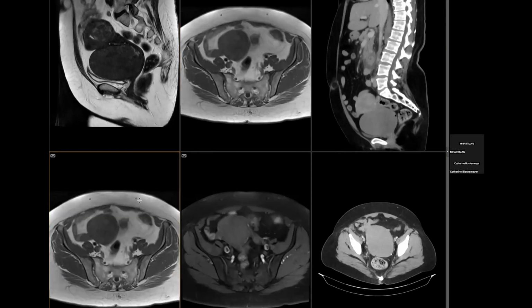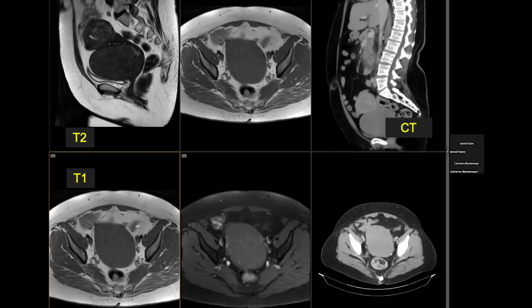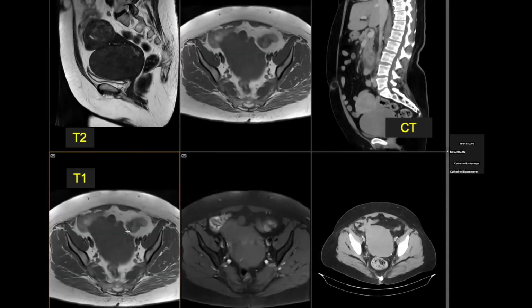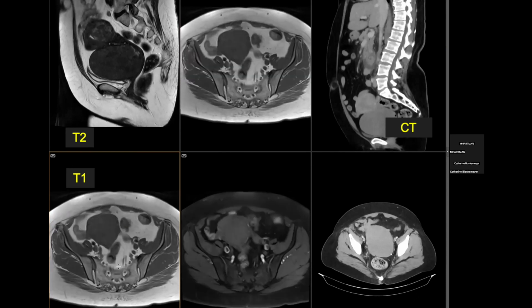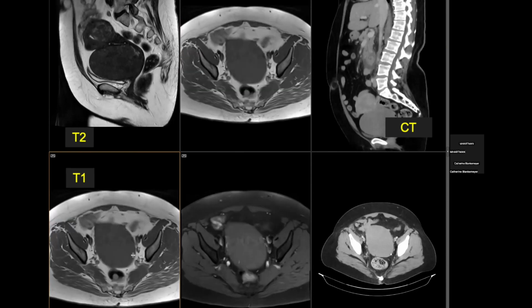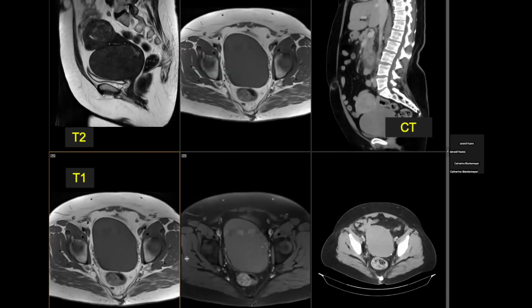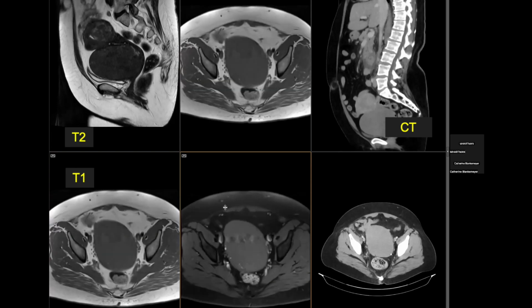Something I wanted to talk about is fat saturation, which is something we'll see on T1 images. So these are our axial images, and I got them linked, and we will see that our CSF is going to be dark. So this is a T1 image. These are axial images. Our bladder is also dark, so T1, but this is also going to be T1, and I'll give you guys a couple seconds to say, what's the difference between here and here?